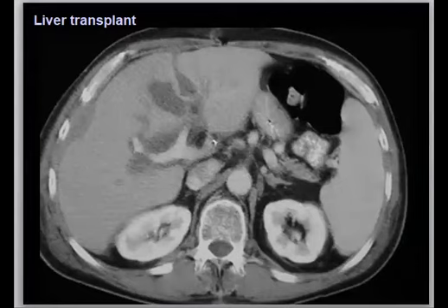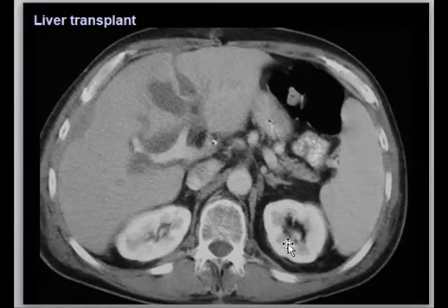This patient underwent liver transplant, as you see. So what happened here? Why did you mention that it's biliary necrosis, Marwa? Because there is some edema and a hypodense fluid density around the vessels, the portal vein. So maybe it is a biloma.